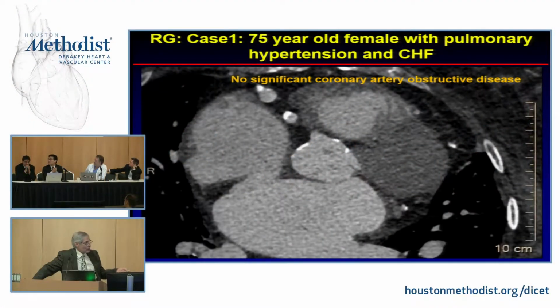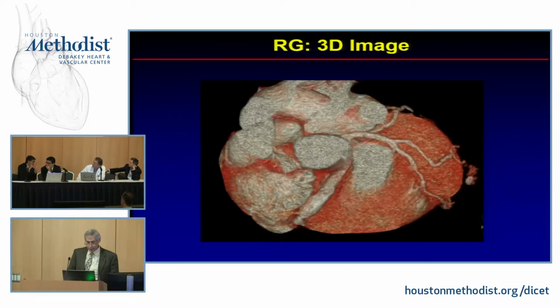The other thing I just want to mention, this is the left atrium, this is the right atrium, and you see this communication here. But the problem is, when you have contrast on the right side, it's very difficult to know if there's a thin membrane that you might be missing here by CT. Even though there's high spatial resolution, you could still be missing a membrane. But it looks like there's a communication between the left side and the right side. Okay, let's go to a different case.